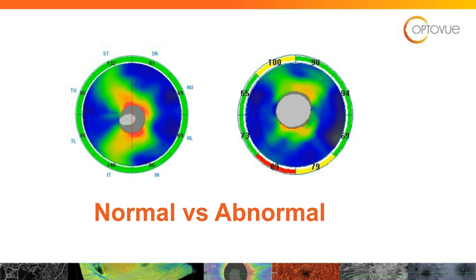So not only, as you compare those two different pictures, are you seeing a difference in the reflectance image, you are also seeing a difference in how that reflectance extends to the border of the scan that you're taking, where particularly infratemporally, you're seeing quite a bit of blue, quite a bit of thinning. So that raises some red flags as well.